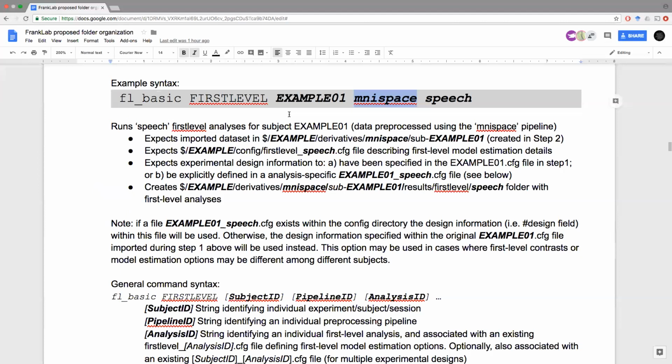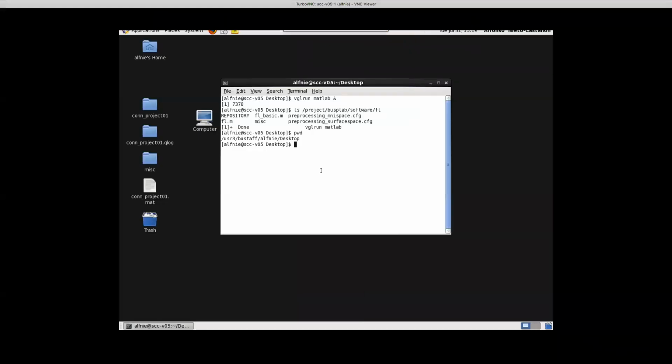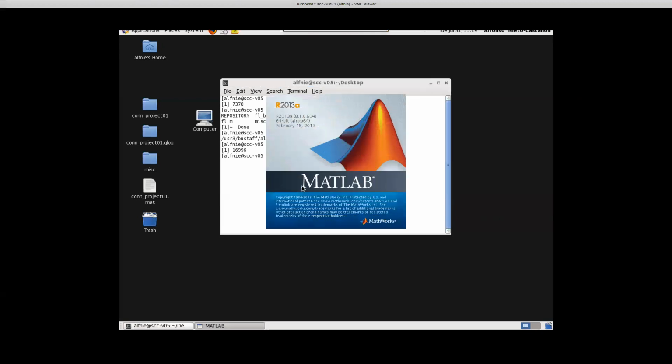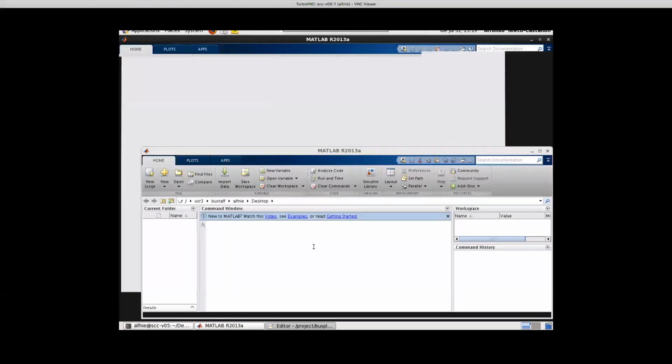Also, the quality assurance plots adapt to the source of your data. There are a couple of things that I'm still changing to make it as smart as possible. There is one quality assurance plot that I'm missing for surface level data that I want to incorporate, and it's still not there. But most of the times you will actually get your plots. Let me show you an example of this. I'll just show data sets, because I think that's the only one that we have so far that has been run through the surface level preprocessing pipeline. So I'll use that as an example.